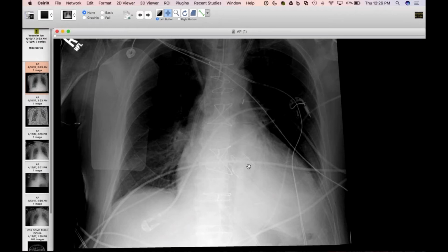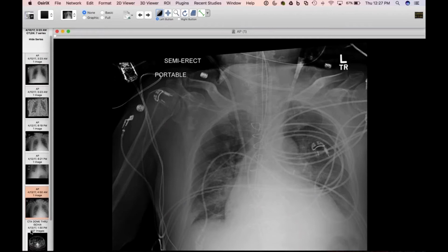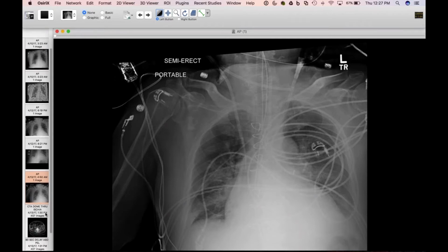This one I'll show. This patient had a recent aortic valve replacement, had some coronary work done at the same time, and you can see he's got an intra-aortic balloon pump. The tip of the pump is maybe not as high as we like to see it, even though I know we've talked in the past that oftentimes when they're placing these, they use the left mainstem bronchus as a place of reference. But that was on the 10th. He was doing a little bit better, and by the 13th you can see it's a little bit lower right here, and his cardiac function was improving, but all of a sudden he developed abdominal pain.